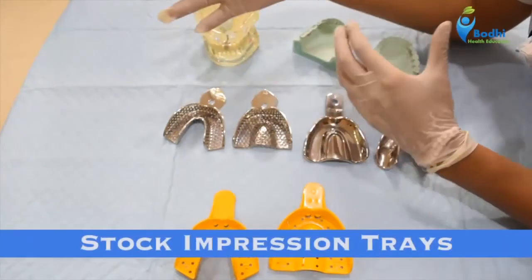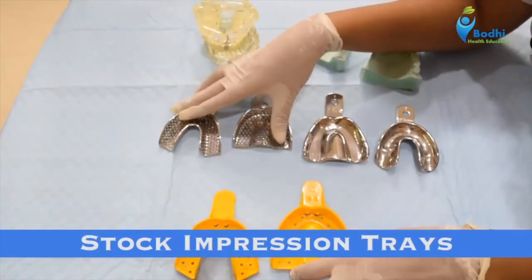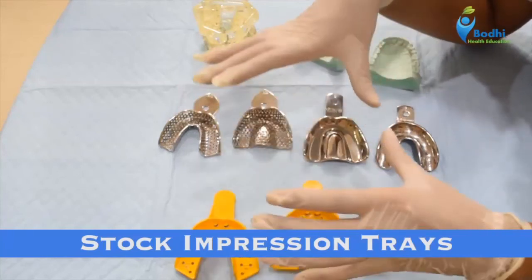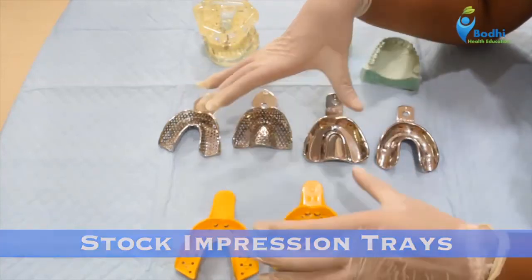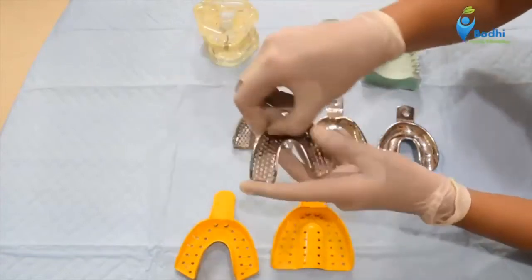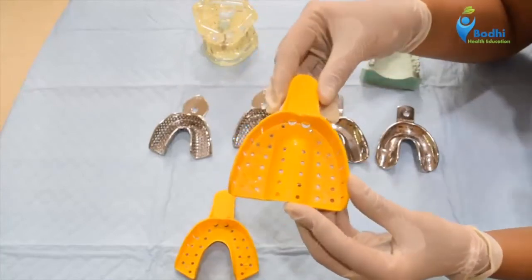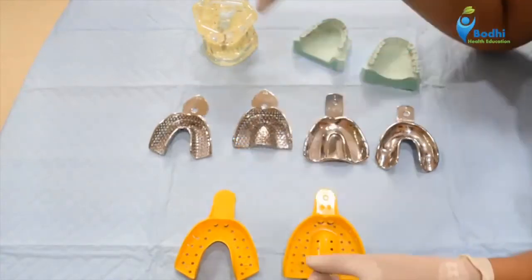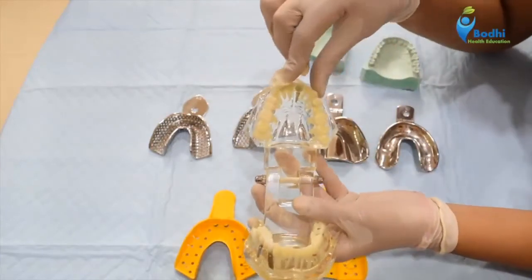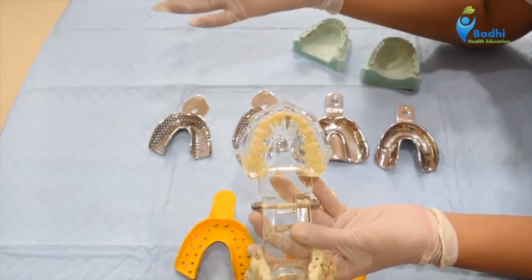So the impression trays can also be classified as the stock impression trays. These are all stock impression trays. They are prefabricated. They come in various sizes. The various sizes of the impression trays can be from extra small to large sized impression trays. Depending upon the jaw size of the patient, the impression trays can be chosen for the accurate size.